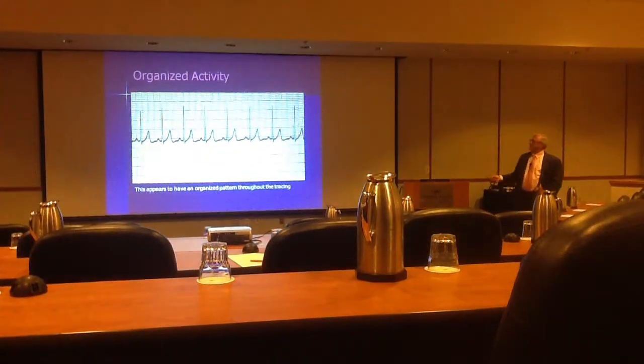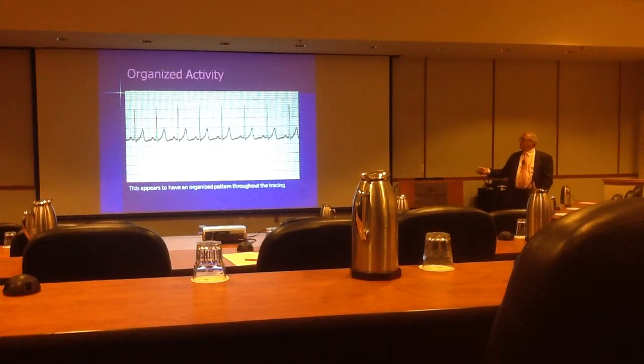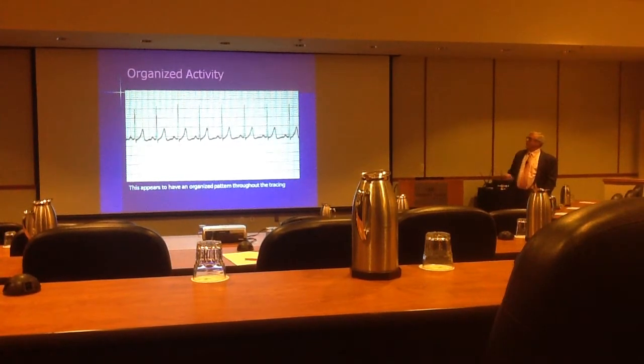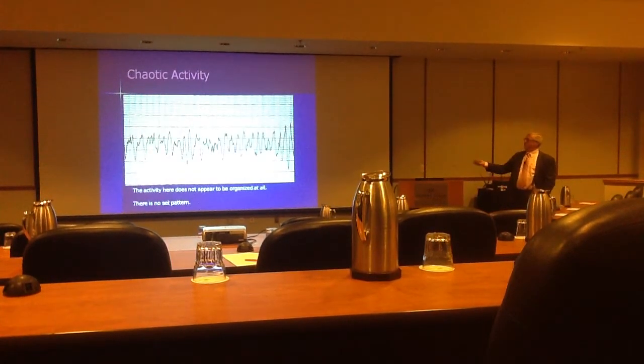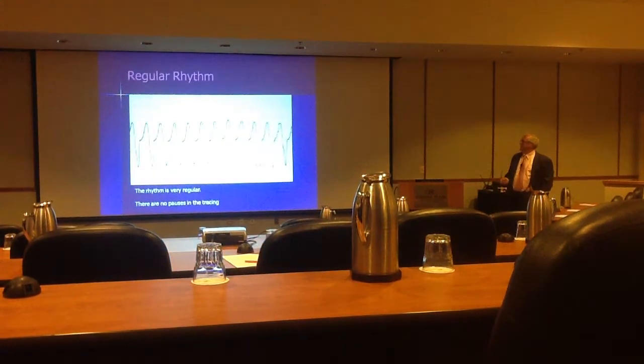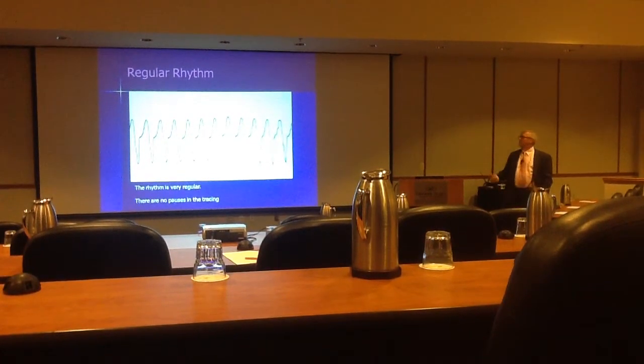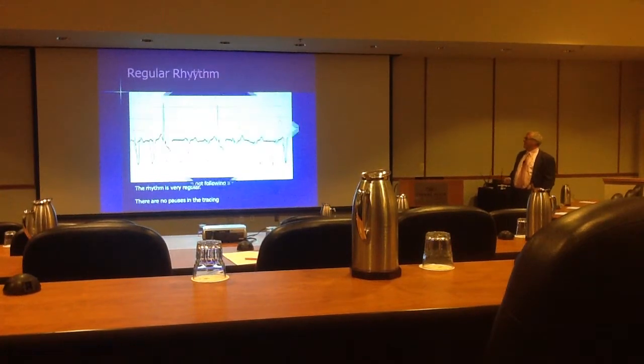So when you look at something like this, you go, hey, that's pretty well organized. The patient may be dying, but the electrical activity in the heart looks pretty good, as opposed to something like this where you say, I bet you that patient is dying, or else somebody didn't connect the leads to the machine. And you get something like this, yeah, the rhythm's very regular, but it's a bad rhythm. But it is regular, so there's some kind of organized activity going on there.